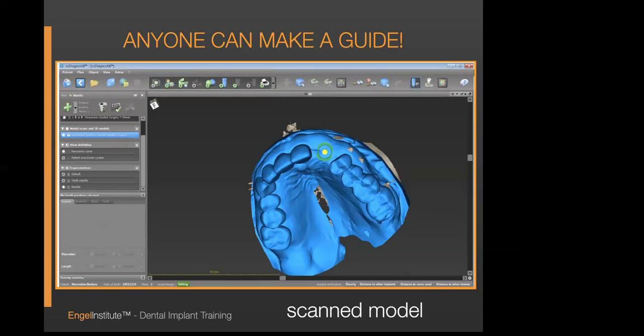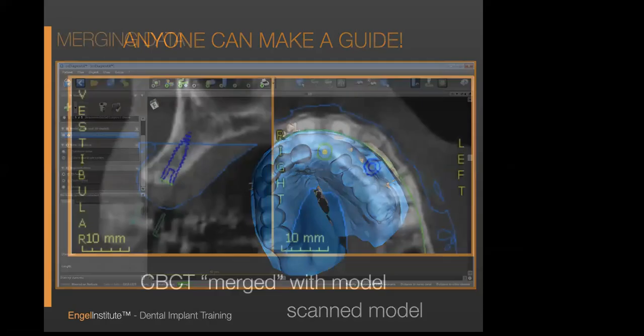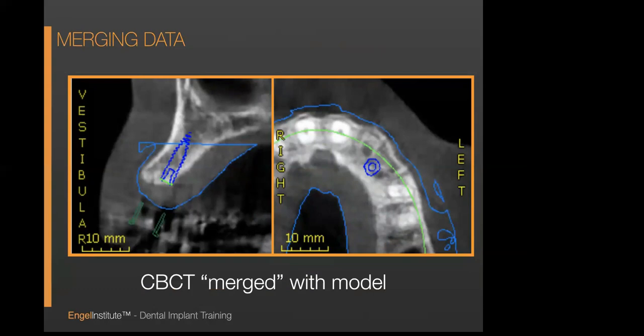So what you're looking at right there is the exact position that my implant had to go to essentially have a canine that looked really, really good, and then a lateral incisor that was cantilevered that looked really good, except it was a peg, so to speak. Okay, let's look. So here was my plan.